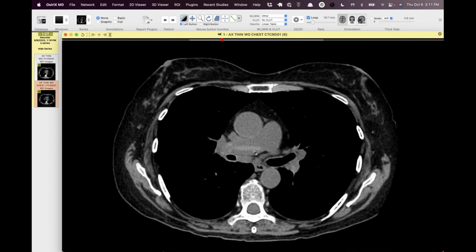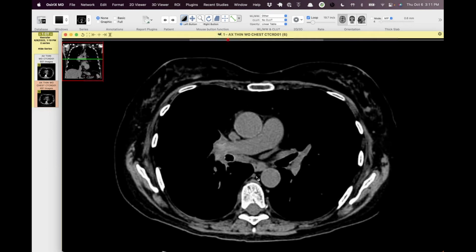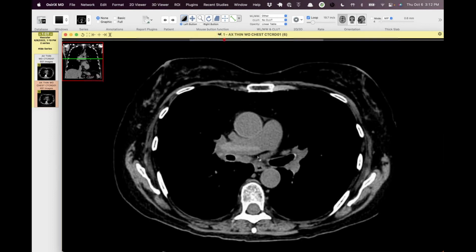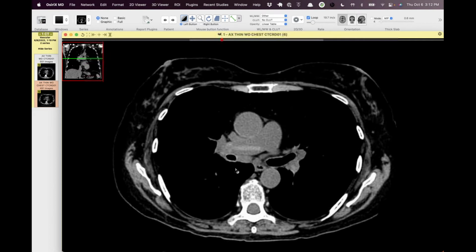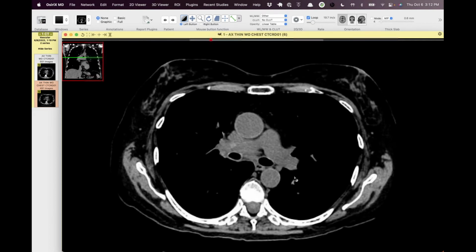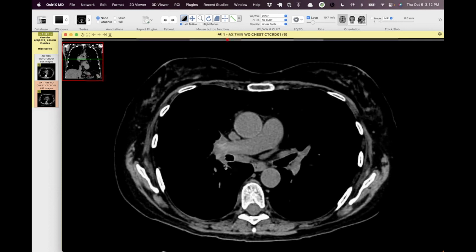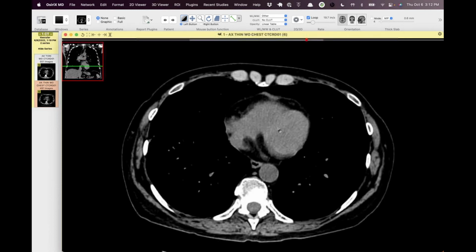You can see that node is there, but right in front of it, on this non-con, this is probably one of the best examples of pulmonary embolism on a non-contrast CT that I've ever seen. You could see the individual emboli going into even lobar, maybe even segmental arteries in the right lower lobe here. This patient was asymptomatic.